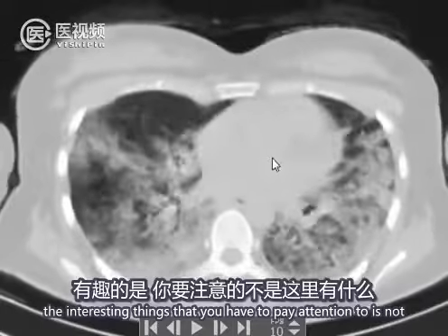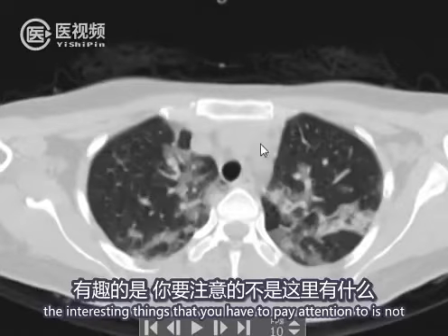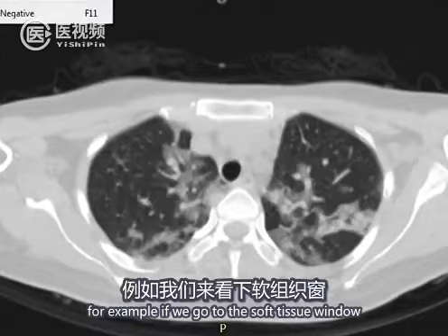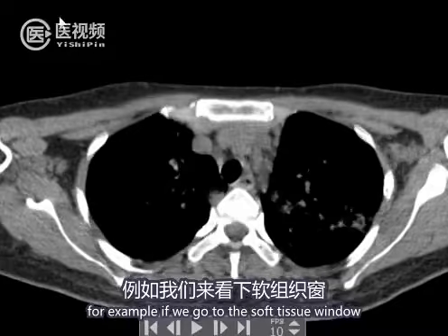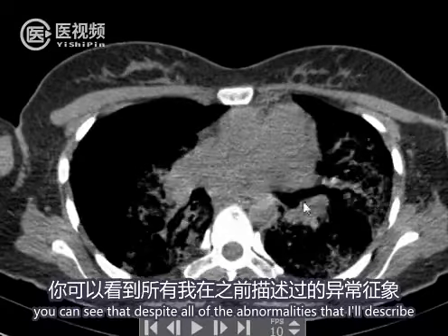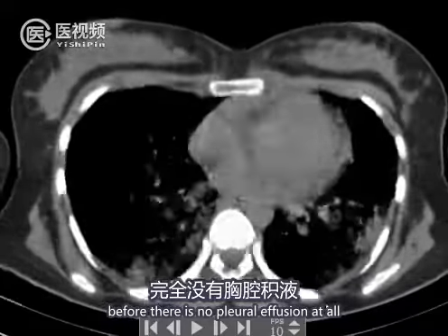The interesting thing you have to pay attention to is not what's there, it's what's missing. For example, if we go to the soft tissue window, you can see that despite all of the abnormalities I described before, there is no pleural effusion at all.